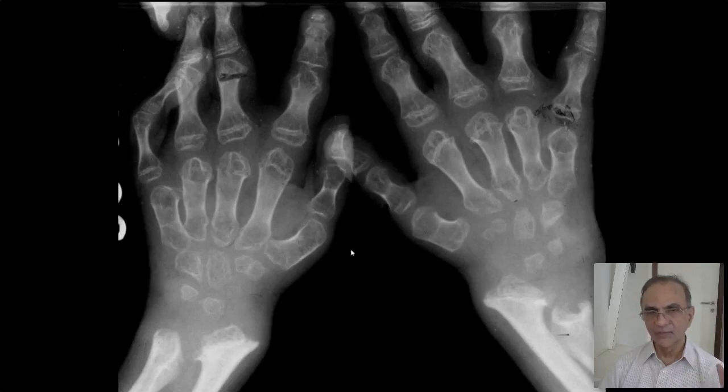So how do you tell spondyloepiphyseal dysplasia, SED, from MPS? Look at the base of the metacarpals. Works every time. Okay, almost every time, 99.9%. Pointing at the base of the metacarpals is diagnostic of MPS. Of all the dysplasias that you will see, MPS perhaps is the most common. Luckily, it is treatable, expensive, but still treatable.